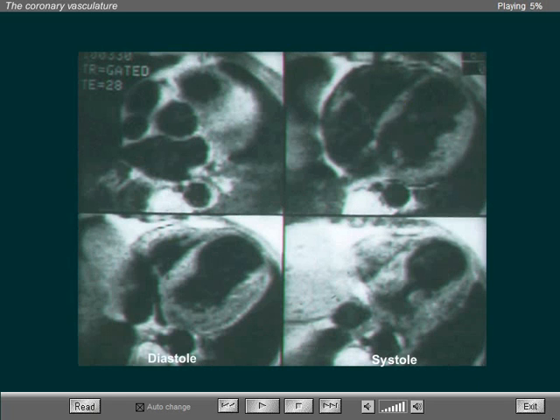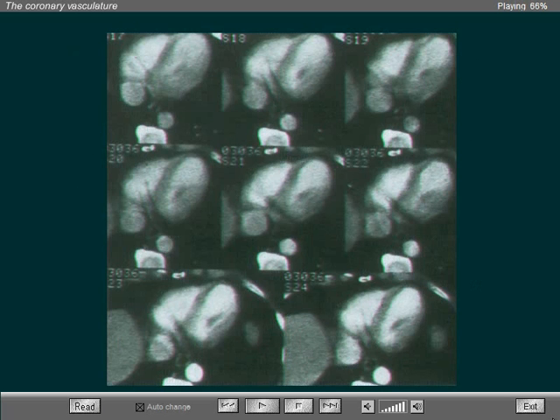These are sequential cross-imaging sections of the left ventricle that had an aneurysm. And note that in the lower cuts, we note the hourglass deformity of the left ventricle and the akinetic periapical portion with marked thinning of its wall. In the next one, we can see the aneurysm of the left ventricle with the chambers opacified. Note that the septum appears normal, but the periapical portion fails to contract due to the presence of the apical aneurysm.